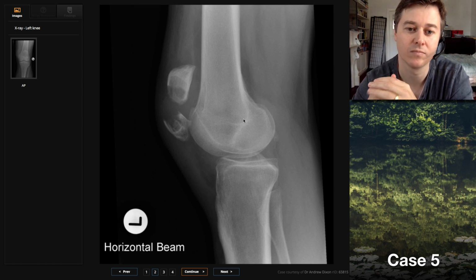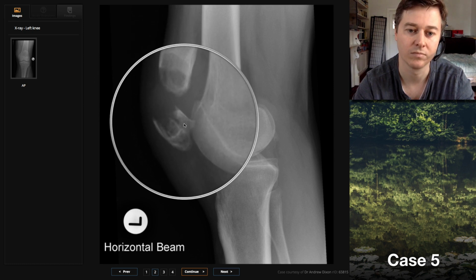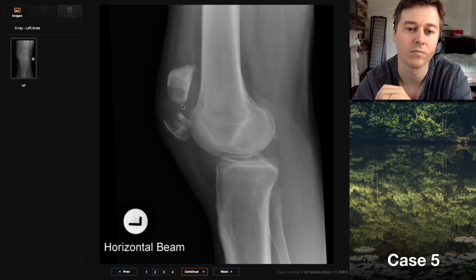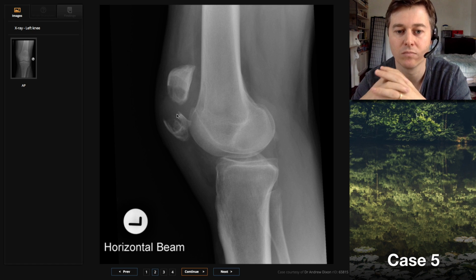So again, on the lateral, confirming the separated fracture fragments with that lucent lesion, which I think has a very narrow zone of transition. There's no periosteal reaction. There is some soft tissue swelling, which would be compatible with a hematoma seen in between the fracture fragments. So I think this is a lesion that has non-aggressive features, but we have a pathological fracture associated with it.